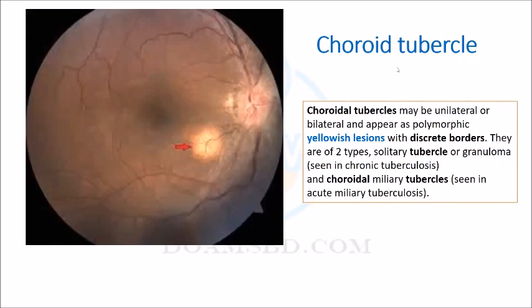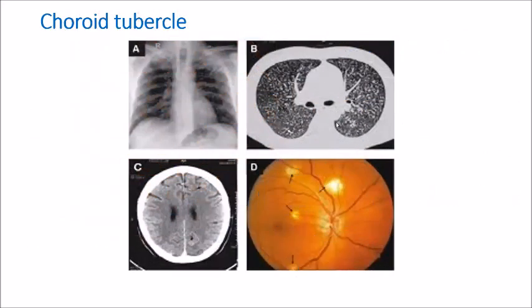Choroid tubercle. So the name is telling whether the tubercle is in the retina or the choroid. Sclera, choroid. So this is the choroid. The choroid tubercle is suggestive of tuberculosis. So this is a focal granulomatous lesion in the retina, more likely in the choroid. For that the name is choroidal tubercle. Choroidal tubercle characteristics are shown here. Just make a snapshot. This is one presentation of this focal feature.